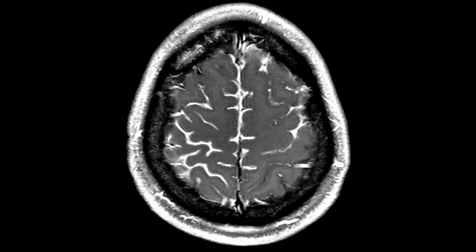All right? Here we go. Let's just look at one, big. Oh, yeah, okay. Here's the point. Every single sulcus, almost 98%, is full of contrast-enhancing material. And in this world, in my world, which is the cancer hospital, that's going to be leptomeningeal disease until proven otherwise. All right, here's a biopsy. This is it. Open biopsy, which was good, so we got a nice representative sample. And I'm going to tell you, because it's not obvious at this power, all of that stuff is in the subarachnoid. So that is a big dilated subarachnoid space, okay?